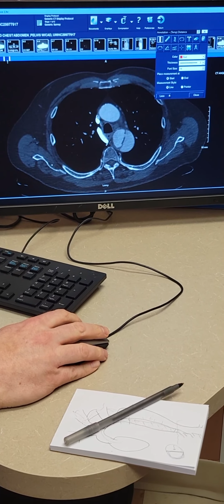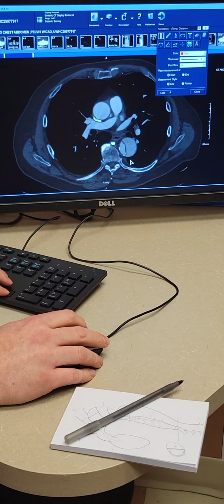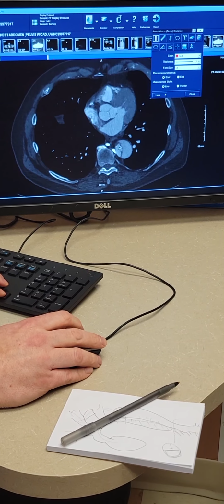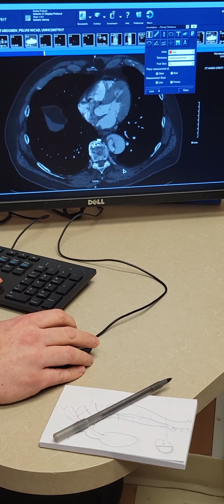And so then as we come down, you see that connection there. There's a big one there. We're coming down through your chest here. This is the true lumen here, is the smaller one, which is usually the case because, again, this wall is weaker, so it bulges out.